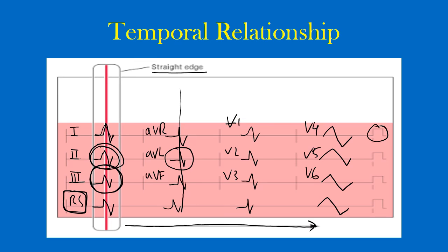Alright, so that's the end of this lecture on the EKG paper. Not a very long or complex topic, but one that will be very important as we move forward. Next, we will look at the basic components of the EKG complex.